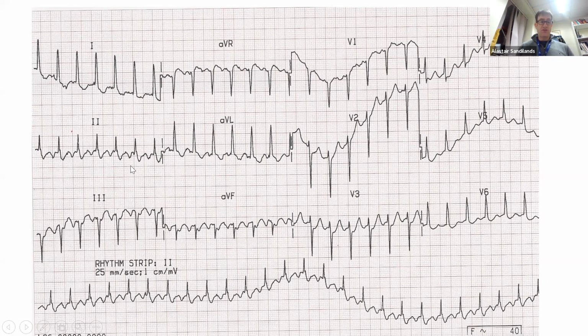But now we need to go to the inferior leads to confirm that. And you can see, look at this. Can you see this wave? It almost looks continuous. It looks sawtooth. So you have to try and superimpose it. And you see it very well here along this rhythm strip. There's the flutter wave. So it's a continuous wave now. It looks slightly different here because of the T superimposed. And there's the QRS. But we have now a continuous wave. It's not focal or discrete. You best see it in the inferior leads. So this is an example of atrial flutter.